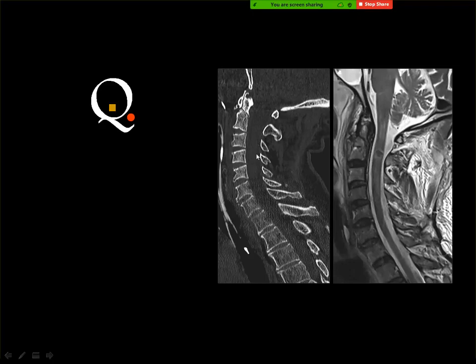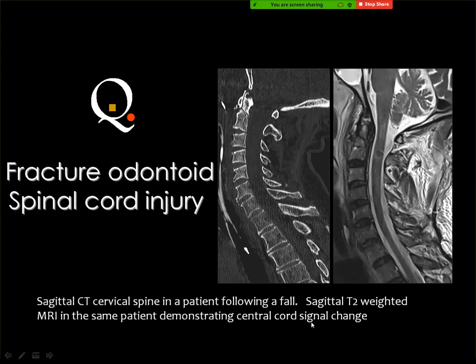This region is frequently missed during the evaluation of the spine because we usually concentrate on the disc bulge, herniation and the intramedullary abnormalities. Also, this area is missed because it is not included in the axial images. Then the final answer here is a fracture of the odontoid process and intramedullary acute hematoma.